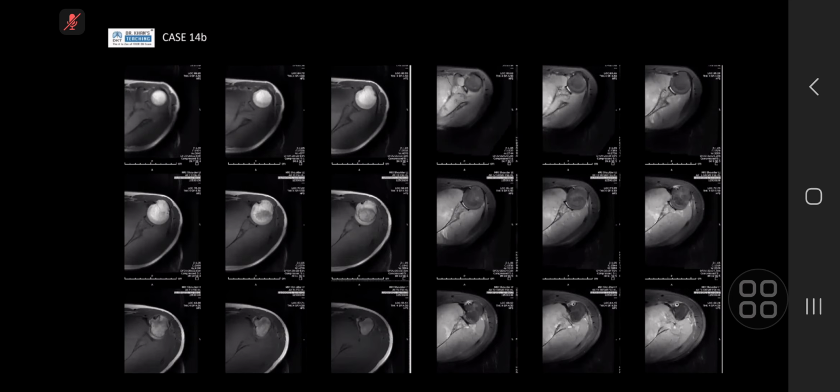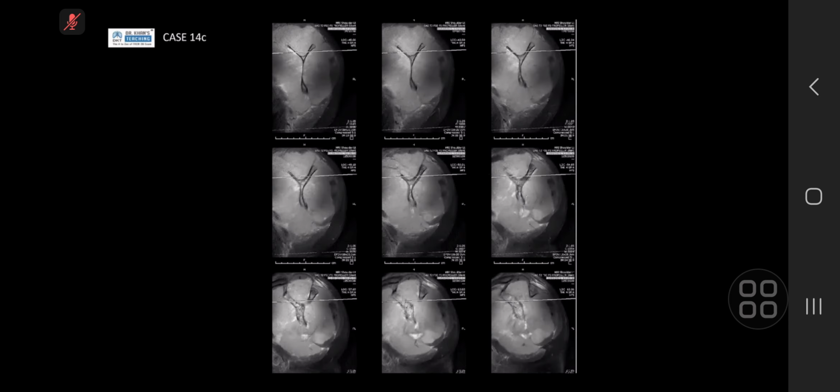and humeral head. So this lesion appears heterogeneous and shows some cortex. So yeah, I mean, you're on the right track. So there is destruction of that. I have seen a case of chondrosarcoma like this, but I'm not sure.